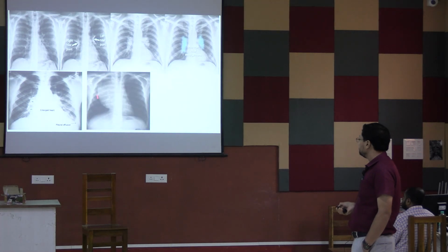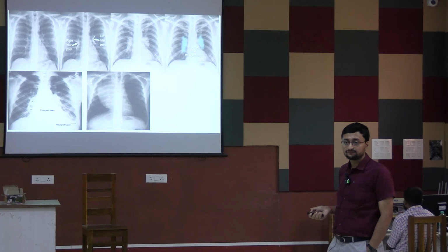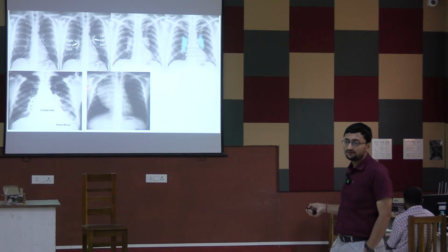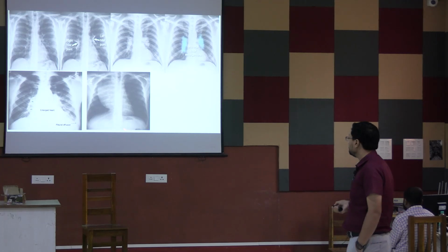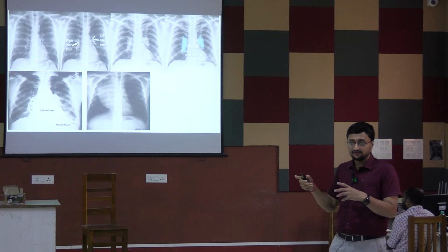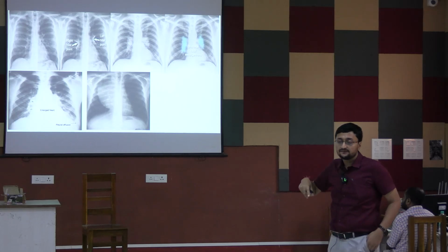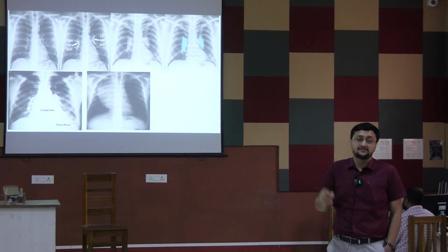And this is also important. এটা কি? This shadow. This is a normal chest X-ray and this is not normal. What is the abnormality? This is a shadow encroaching the right hilum, right? এই শ্যাডোটা দেখতে পাচ্ছিস তো, রাইট সাইডে আছে শ্যাডোটা। This is anterior mediastinal mass, most likely teratoma.